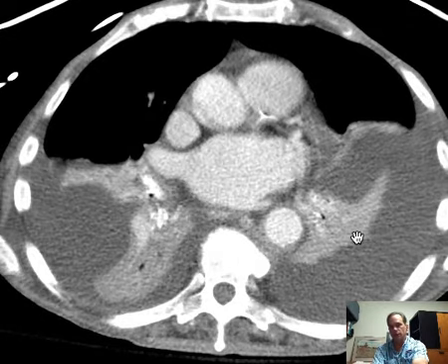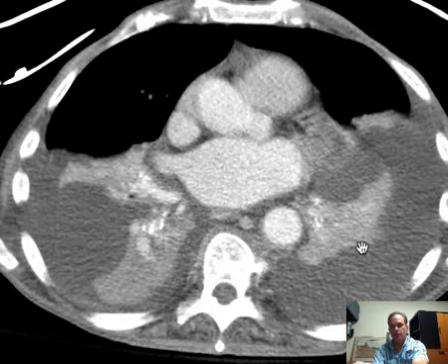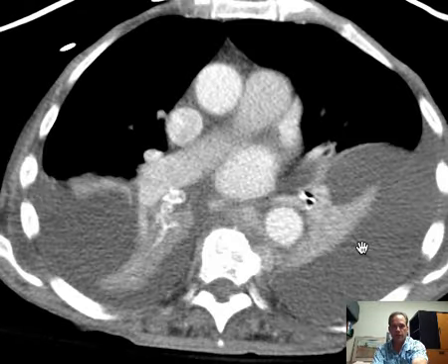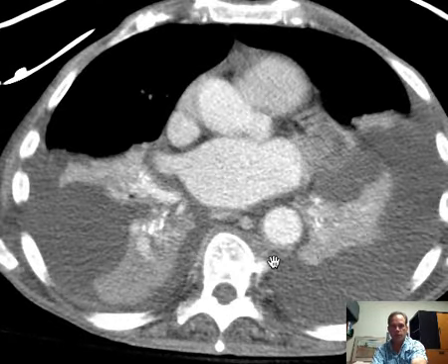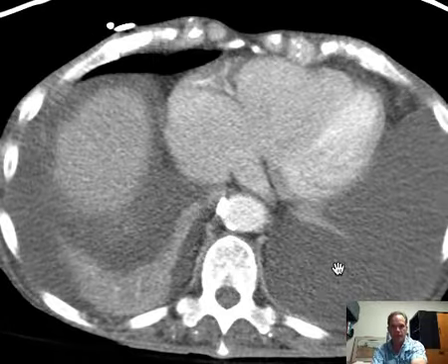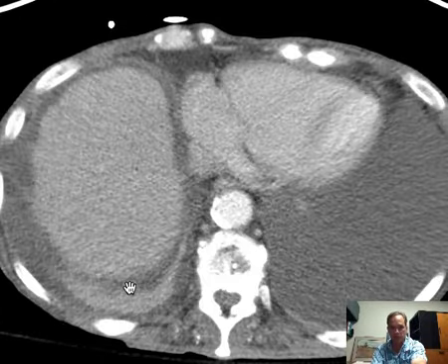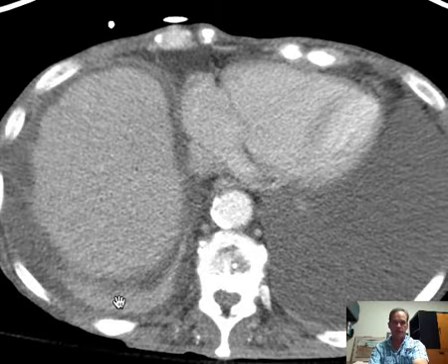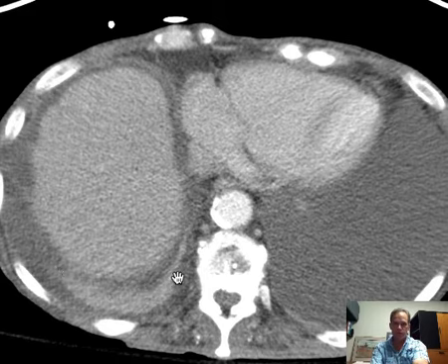So what parts of the lung are affected by this compression or compressive atelectasis? Well, here you can see that it's certainly the lower lobes, because you follow this all the way down, and that's the bottommost, inferiormost part of both lungs. Here on the right, still filling a little bit of the posterior costophrenic recess.